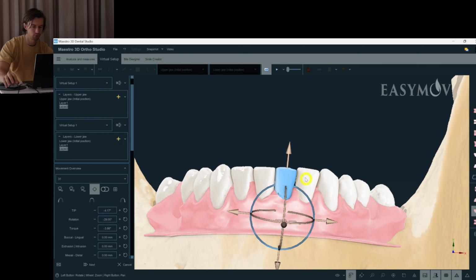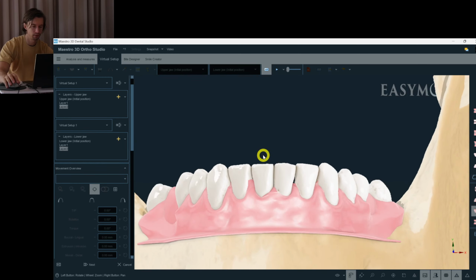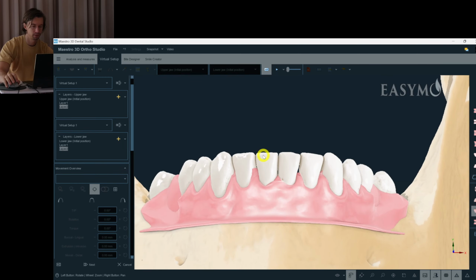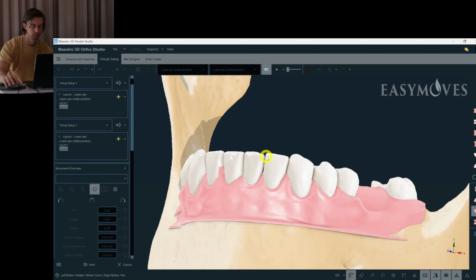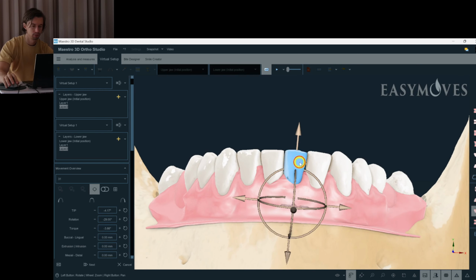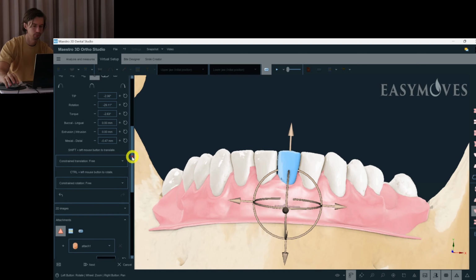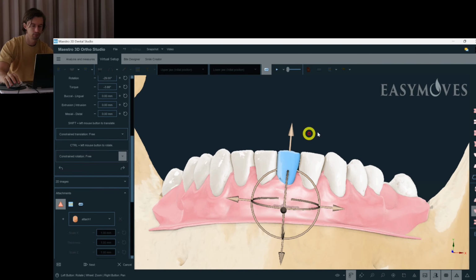I would see the black triangles here, but we can do nothing about this, because even if we improve the angulation, they still persist. So I'm not going to work on this.